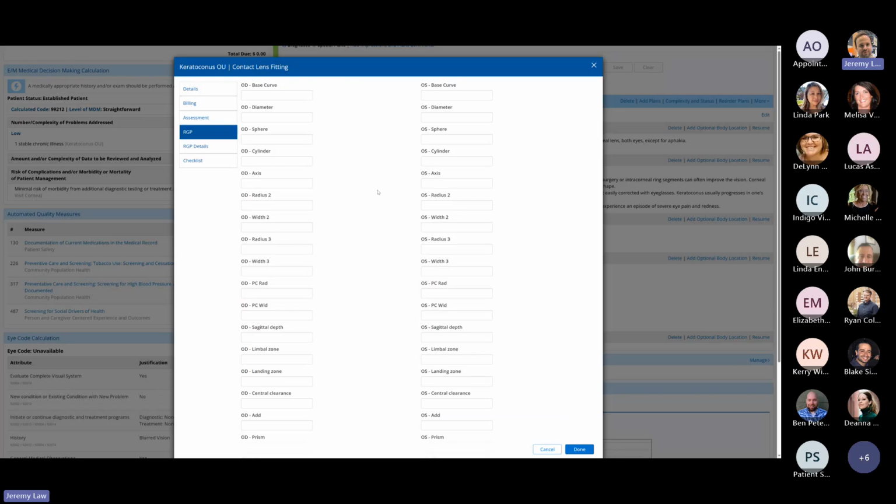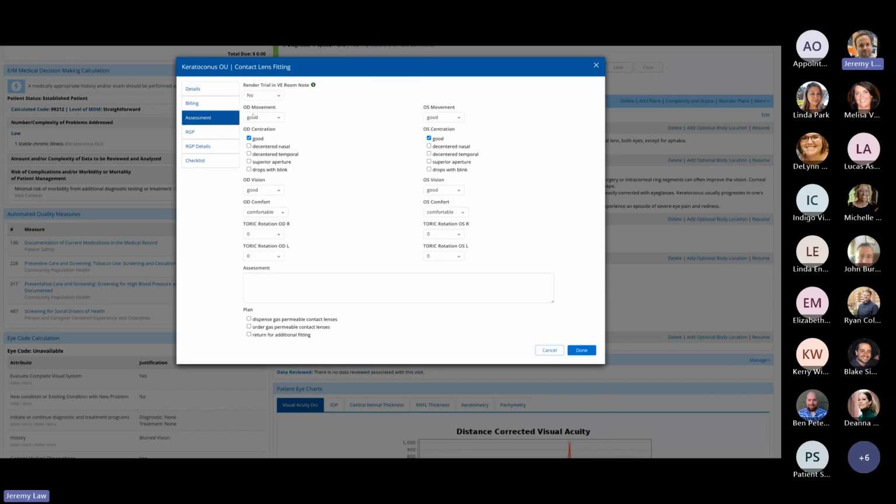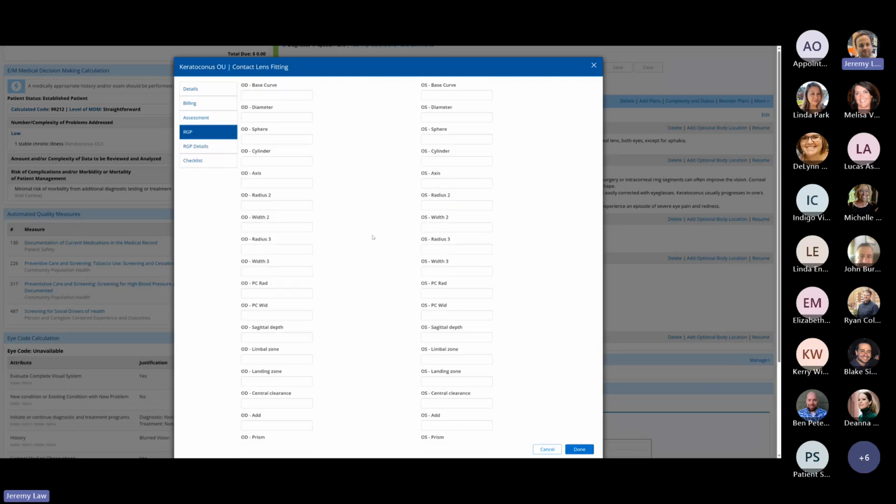So if you have a keratoconus protocol, you could bake in and say, I've got my keratoconus scleral protocol. I've got my keratoconus RGP or hybrid lens protocol. You could automate a lot of this if you want to. Me personally, I don't really use this protocol when I'm demoing too much for a scleral fit, but I'm showing this off just in case you're curious if that's something you want to investigate, because it's a plan, you can actually create a protocol for this.